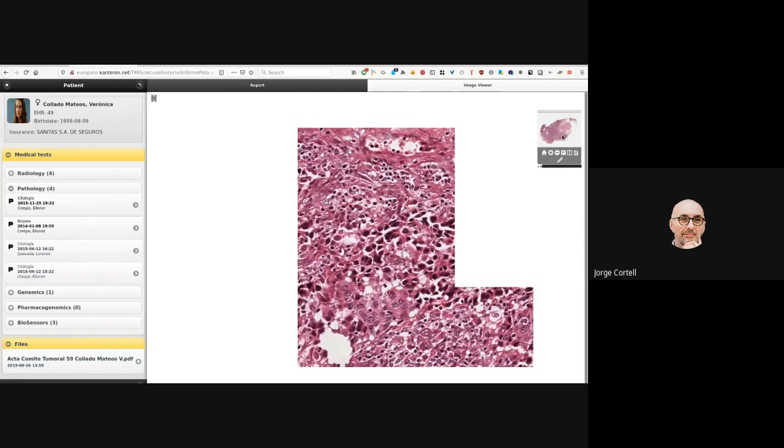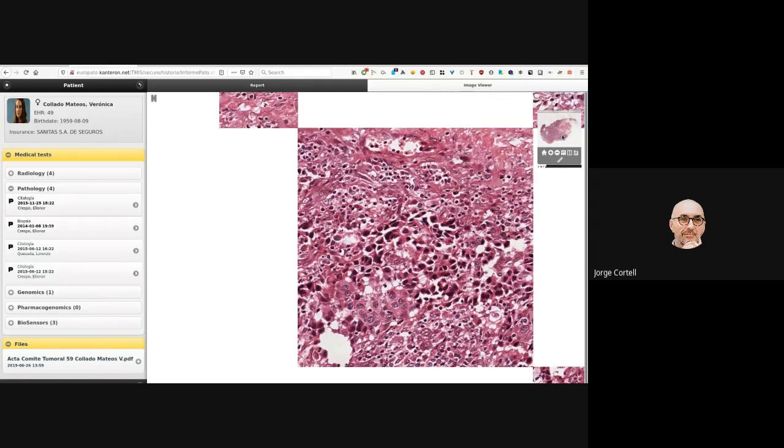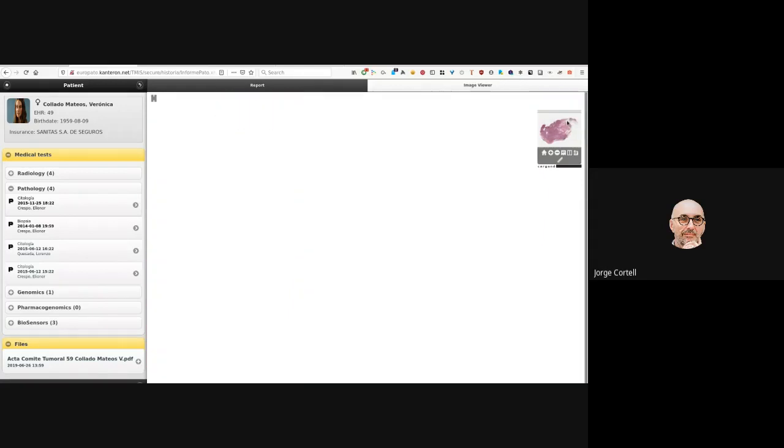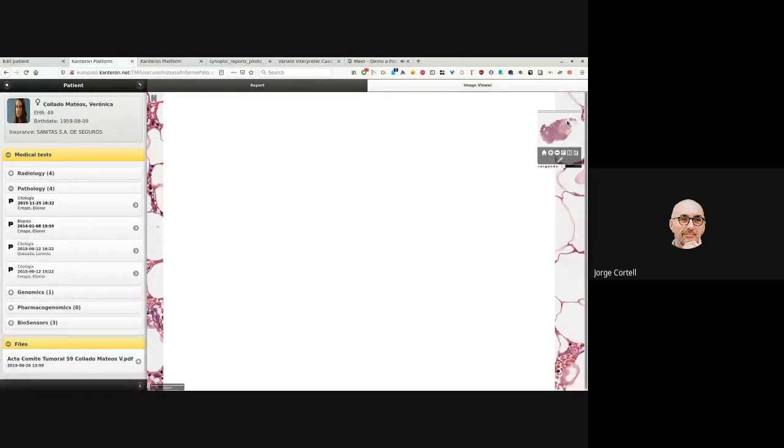For example, you can see that most of the structures here are very similar. When we go here, the structures change. And this could be inflamed cells. This could be fat cells. I'm not a pathologist, so I can't tell. I think these are fat cells in this case, but this is the kind of aha moment a pathologist gets from moving around.